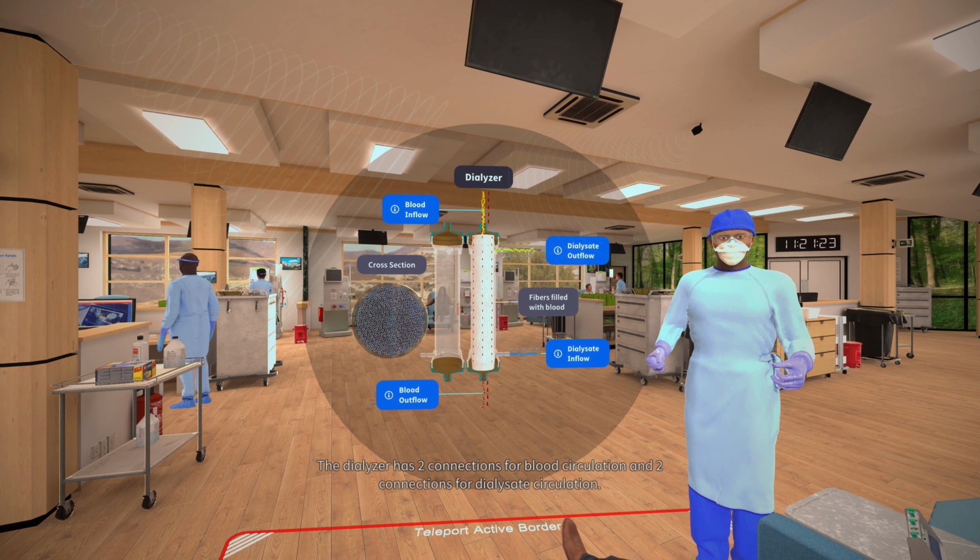Let's look inside. Blood enters the dialyzer through the arterial header. Inside the header is a clay-like potting material that holds thousands of hair-thin hollow fibers in place and keeps them open so blood can flow through them. Dialysate flows around the outsides of these fibers. With each pass through the dialyzer, blood leaving the fibers through the venous header has been cleansed of some of the impurities that would normally be removed by the kidneys.